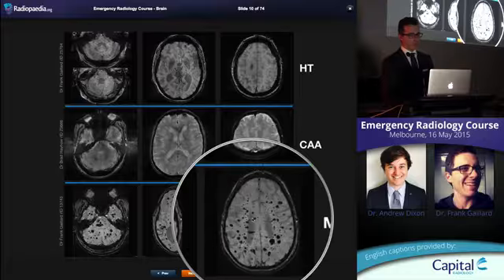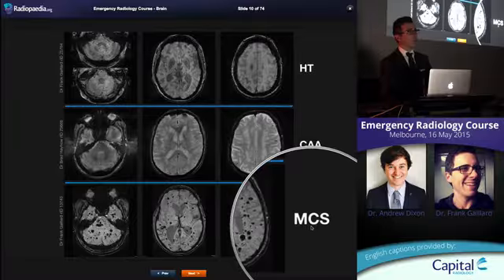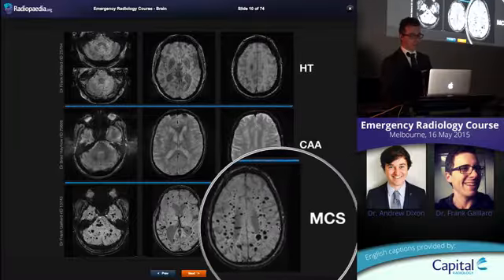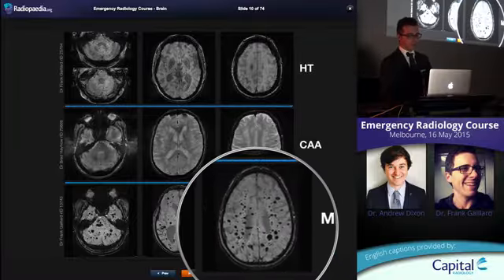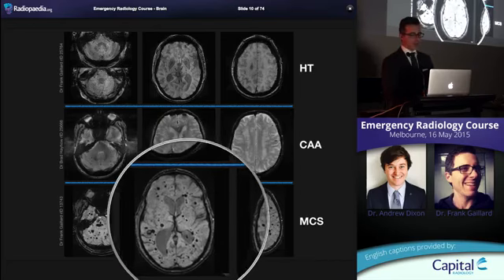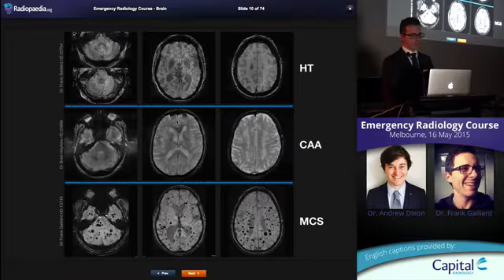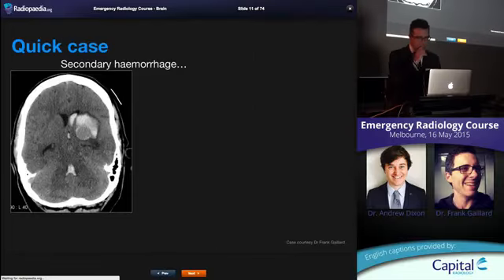This is a rare condition, only put in for illustration purposes. It's multiple cavernoma syndrome, which is an autosomal dominant, not very imaginatively named condition, where you have lots of cavernous hemangiomas. And they're randomly distributed. And just like all other vascular lesions in the brain, they are essentially randomly distributed, so they won't follow a particular pattern. So when should you be worried that there's an underlying cause?